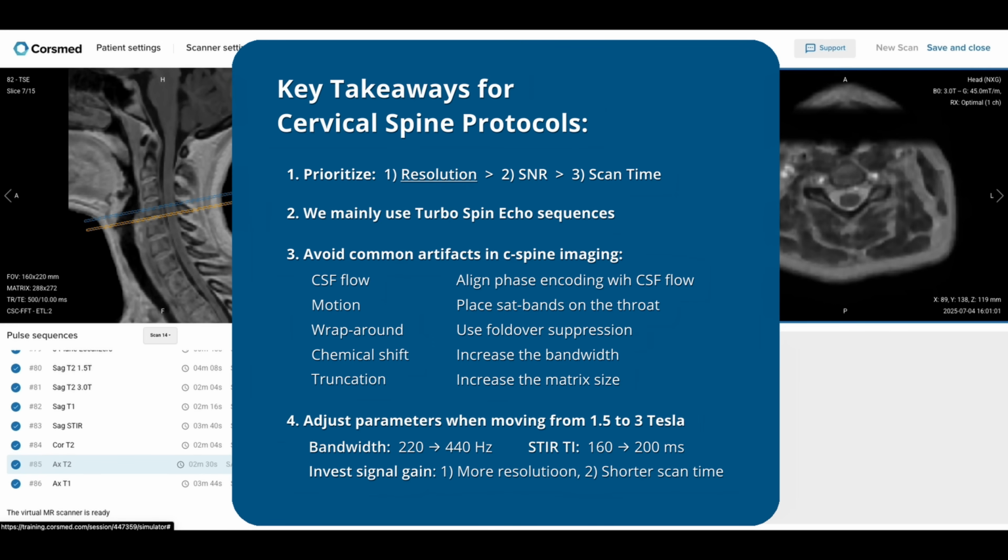If you follow these key points, you'll be able to perform excellent cervical spine MRI protocols.